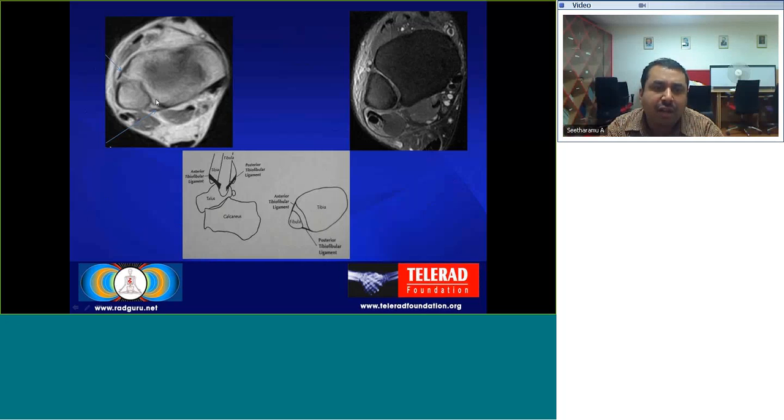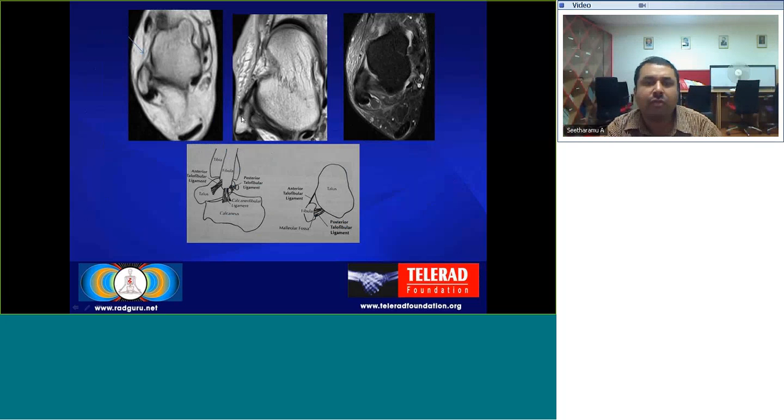Normal anatomy of the anterior and posterior tibiofibular ligaments, appearing as thin lines, sometimes discontinuous. Schematic diagram: anterior and posterior tibiofibular ligament. Schematic diagram of the anterior and posterior talofibular ligaments, a few axial images slightly lower than the tibiofibular ligament.